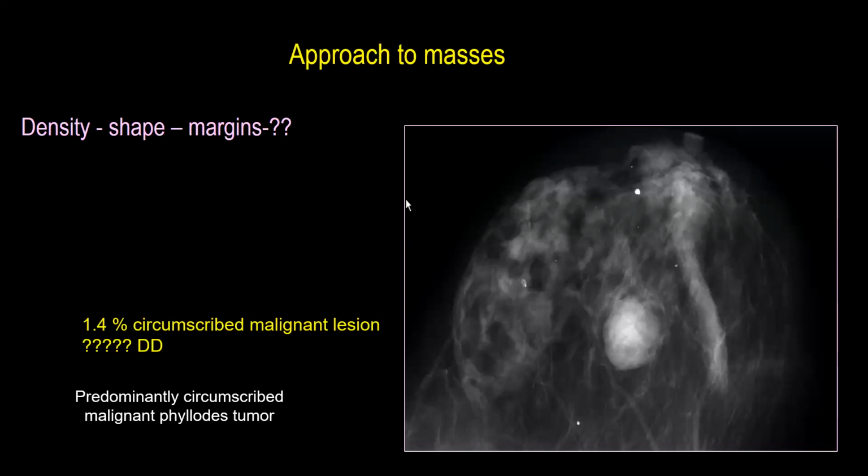With high-grade ductal carcinoma, there is no time to infiltrate or invade, so it grows rapidly in a concentric way as oval or rounded. Especially triple negative or other high grades can present as circumscribed.